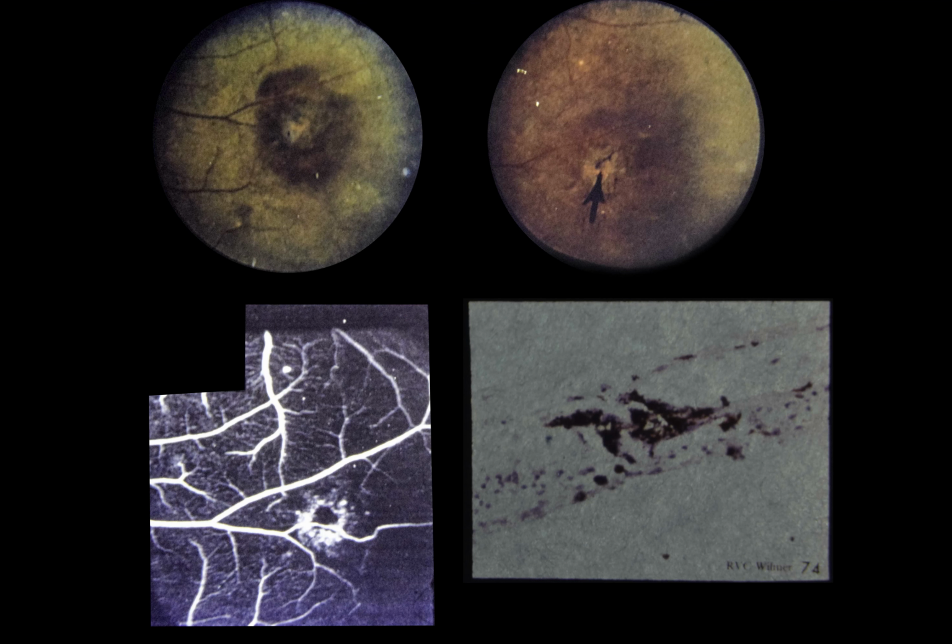Black spicule represents proliferation of pigment from retinal pigment epithelium. Lower left, fluorescein angiography shows capillary closure and obstruction of choroidal fluorescence in this area. Capillary non-perfusion is also seen distal to the lesion. Lower right, in a histopathologic section from another patient with hemoglobin SS, note marked retinal atrophy and pigment proliferation.